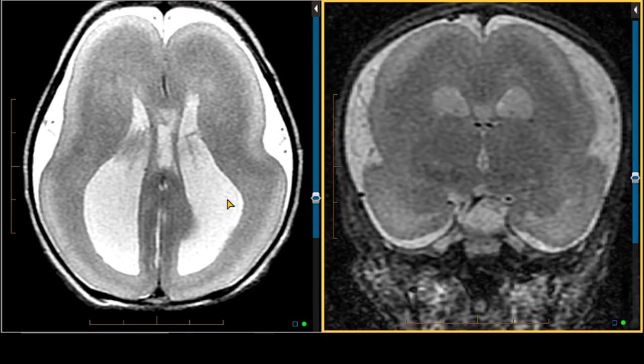At this point, instead of just lissencephaly, which means smooth brain, it can also be referred to as agyria, because there's essentially no gyri. The coronal image here also shows, you can see the temporal lobe is just one single curve on the periphery with no surface undulations. We see that subtle curvature for the concavity for the sylvian fissure, and we're not seeing any sulcation whatsoever in the frontal lobes. This is a fairly severe appearance.